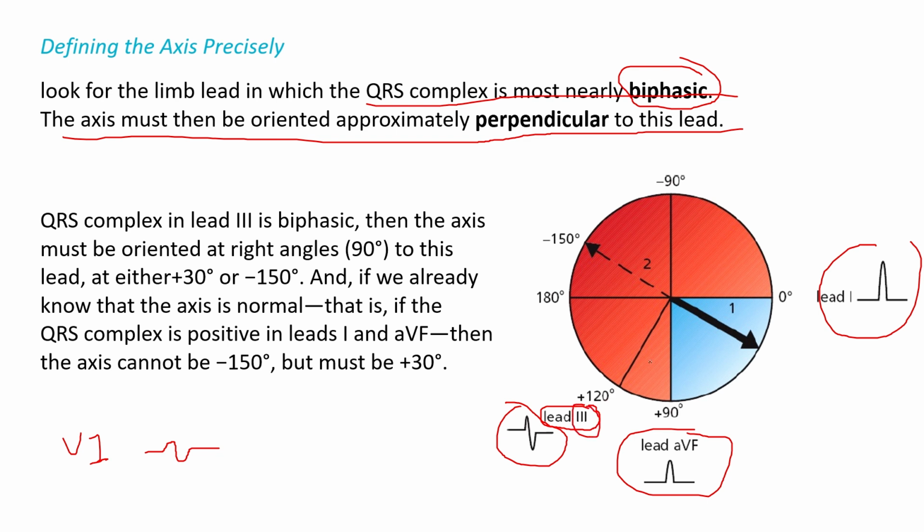Then you will either minus 90 or plus 90. So if we plus 120 with 90, it will get into the negative extreme axis deviation of 150. Okay, but if you minus it with 90, it will be plus 30 here.